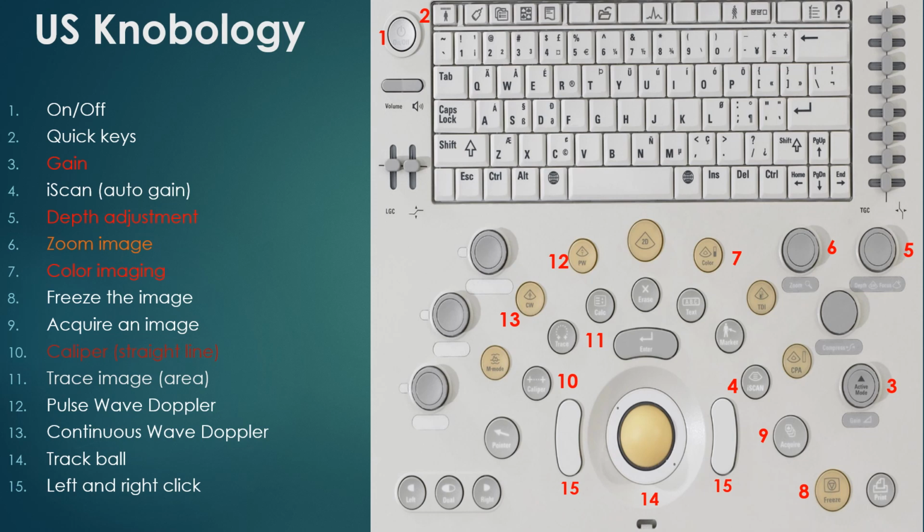Believe it or not, the on and off button is difficult. I mean, it may be marked on and off, but you can't really tell because it takes a minute for the ultrasound machine to boot up. And some machines, the Philips CX50 that we have around, take up to 4 or 5 minutes to completely boot up. So really we have it on at all times if we're doing a laser lead extraction and we're worried about an effusion.